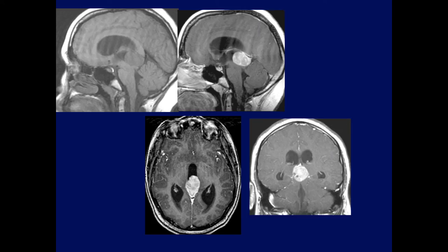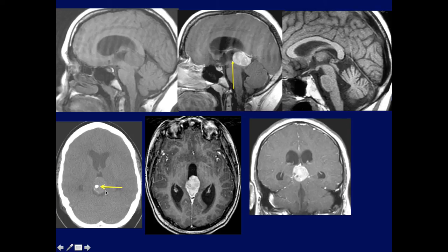Here's a larger lesion. Here it is. Falcotentorial. Notice how it's deforming the third ventricle. Again, CT to the rescue here, or at least confirming the diagnosis, another pineal region meningioma. I just want to point out this very important sign of this kind of like a thumb pushing into the back of the third ventricle, which we see here full of CSF.